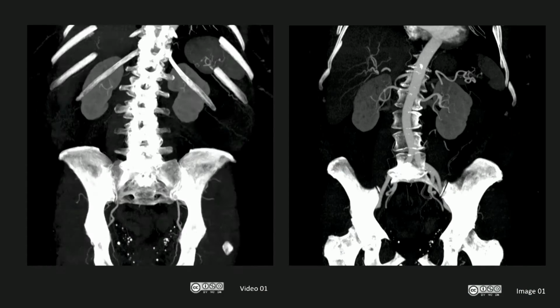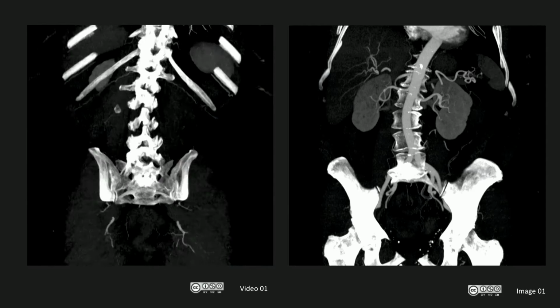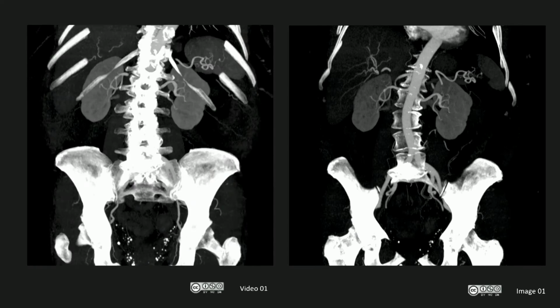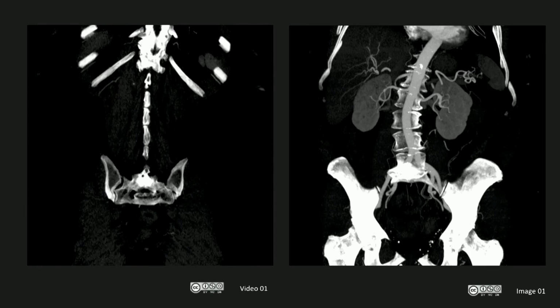We can now see an example of this on real data. On the left-hand side, we can see a loop through the 2D slices of a volume. The MIP reconstruction of the slices surrounding the kidney is shown on the right-hand side. Note that in the video we can see only some of the blood vessels in each frame, while in the MIP reconstruction we can see all the blood vessels in a single image.